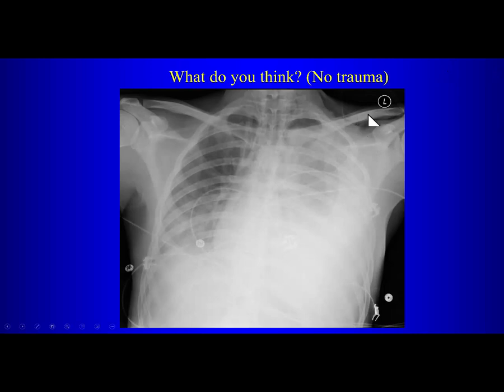So what else would you be looking for in the chest? If you see that, you might look for what? Pneumomediastinum. Is there pneumomediastinum, first of all? Does the patient have pneumomediastinum? Yes or no? We vote no? I vote no. Rest of you agree, no pneumomediastinum here?